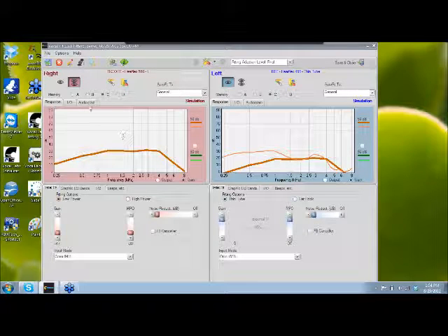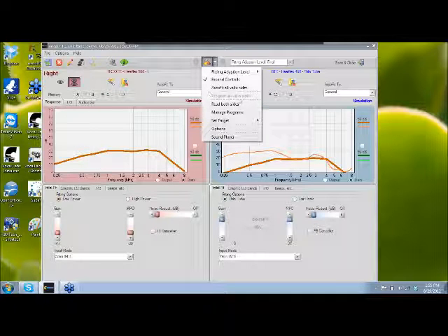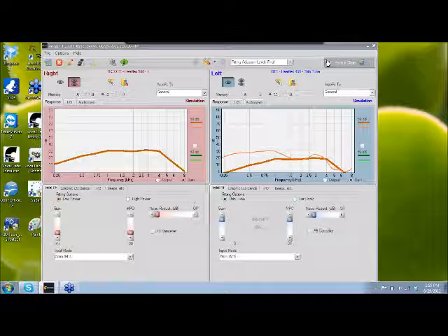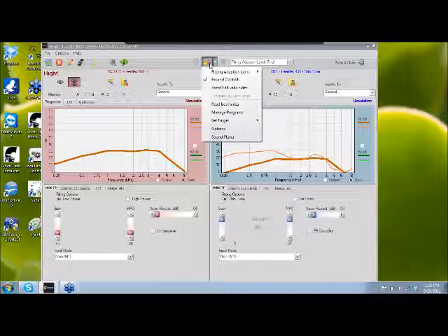When you're finished with this, if you find the scene that you're looking for, remember all the changes you make on Vocal Labs fitting software are put into short-term memory. You'll hear them in the hearing aid right away, but before you're finished you have to either go up here and click program all valid sides, or what I recommend is every time you're finished, go over here and click Save and Close. What it's going to do, it automatically saves your session for you, and it will bring up a little prompt that says, do you want to program the device at this time? Say yes to that. That is the same thing as going right here.